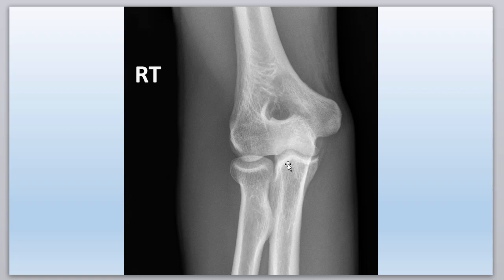Okay, and let's look at the radius here. So we got this big bump here. That's easy to mark, right? That's for the biceps common tendon, and the biceps brachii hooks in there. So that's the radial tuberosity. Some older texts call it a tubercle, but tuberosity is probably a better name. So here's this big bump here. That's the head of the radius, the radial head. Here's the radial neck right here. So this would just be the shaft of the radius here.